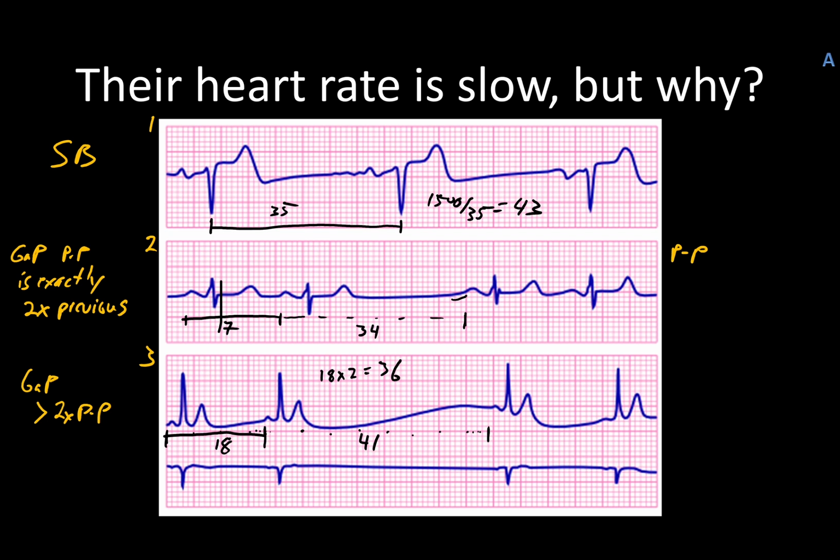Why is that important? Why do we care? Well, what that does is makes the difference of calling this one sinus rhythm with sinus exit block, and this one sinus rhythm with sinus arrest, which is exactly the idea. All right, so we'll move forward and I'll walk through exactly what makes up the rules for deciding this kind of stuff.